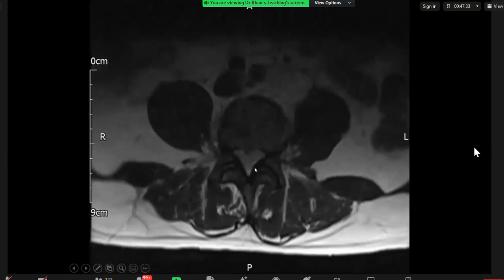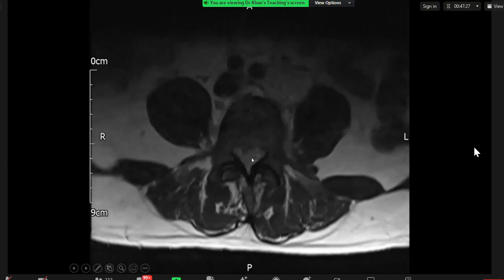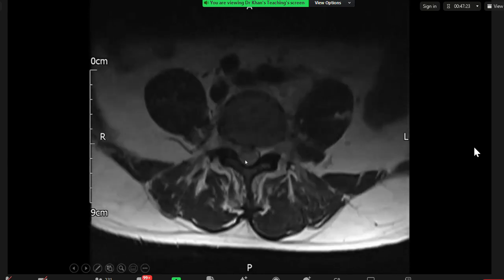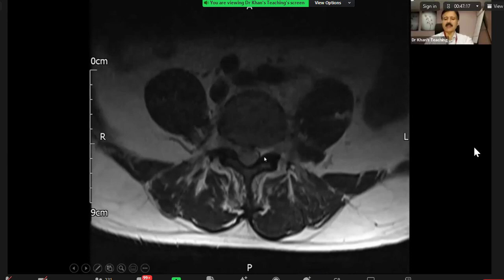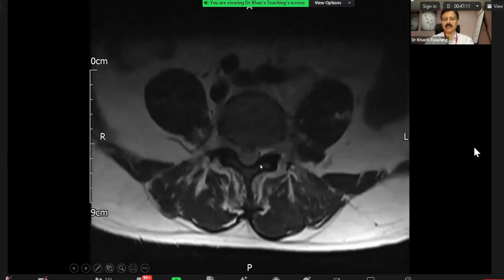So starting from the first slide that I have got here, these are Cauda equina nerve roots. So there is crowding of the nerve roots and also thickening of the nerve roots. Something anteriorly is pushing it. Now here, go to the next slide. Go back. Yes. So your finding is right about crowding. Something anterior to the thecal sac. What do you think? What is it?